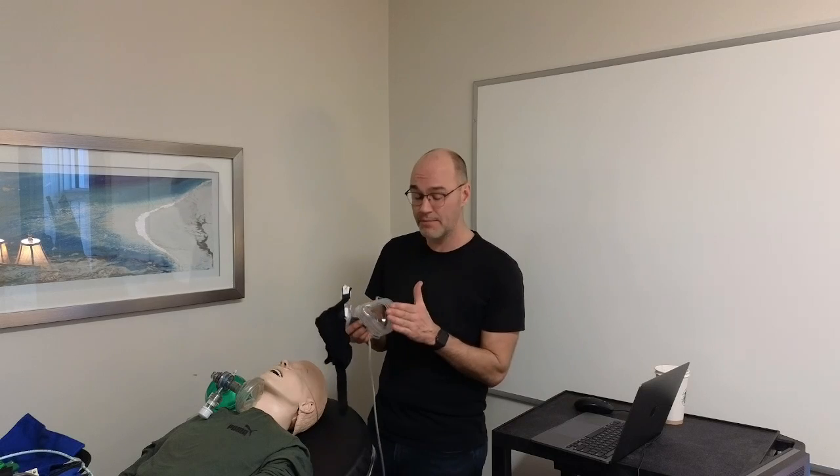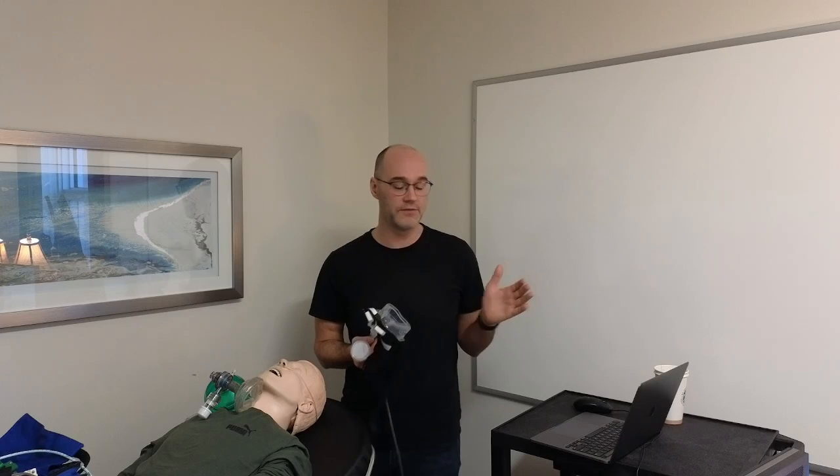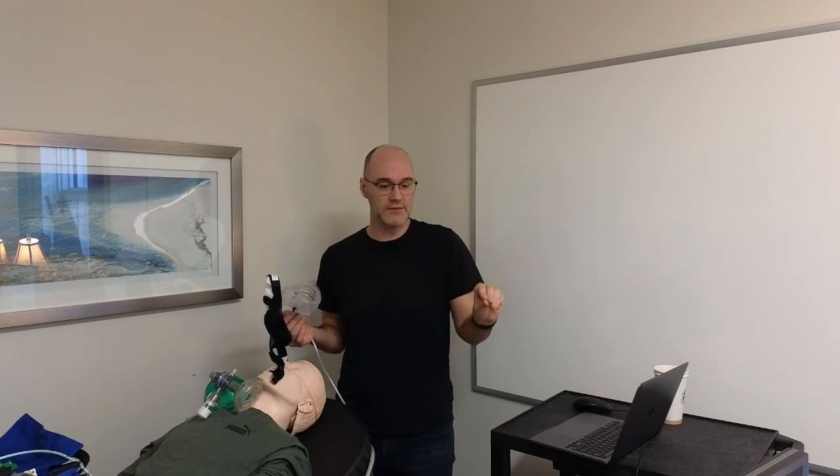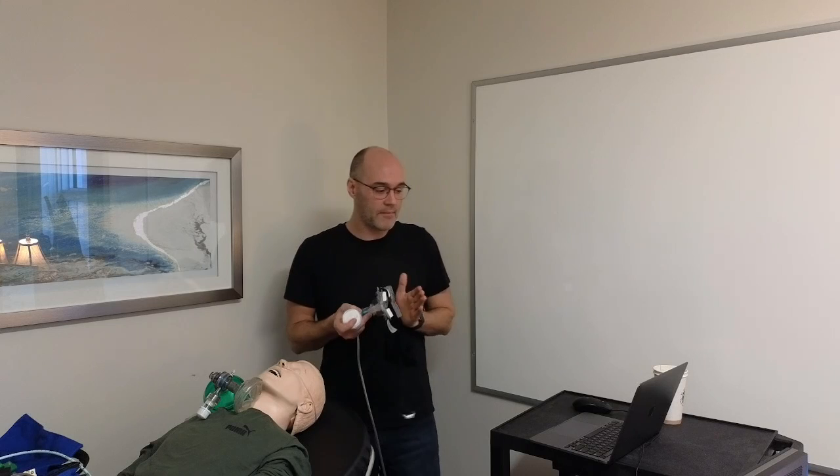So what does it do to the patient? On the airway side, it's going to decrease atelectasis, so areas of the lung that aren't being ventilated effectively. You can think of those as collapsed or obstructed airways because of narrowing, and this will help splint those airways open, both the alveoli and the tubes themselves. That will then increase the alveolar surface area that's available for diffusion. It also adds a little bit of pressure on top of the gas, so a little bit higher partial pressure of oxygen going across, and it helps with the diffusion of oxygen across the membrane of the alveoli. This decreases ventilation-perfusion issues, where an area of the lung wasn't being ventilated, so you're getting blood to it but not enough air to it, and that will improve oxygenation. That's primarily what we're thinking of.